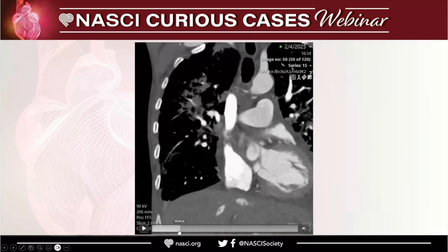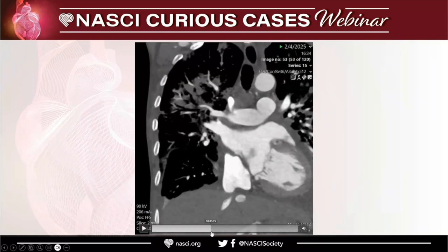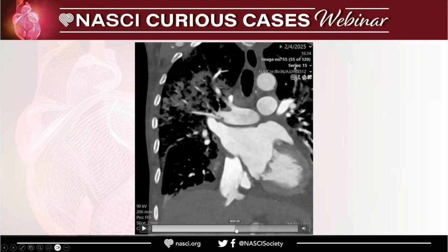We have this area, which we usually do not see like that. So in a patient with sepsis, maybe a small perivalvular abscess. Yes, that's what I wanted to discuss with you earlier, Ismail.